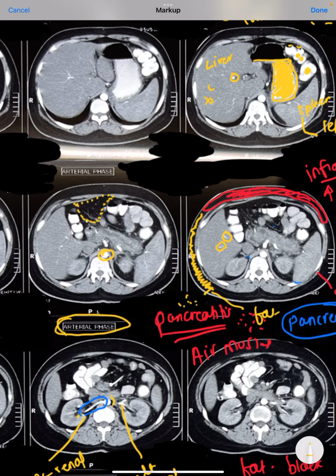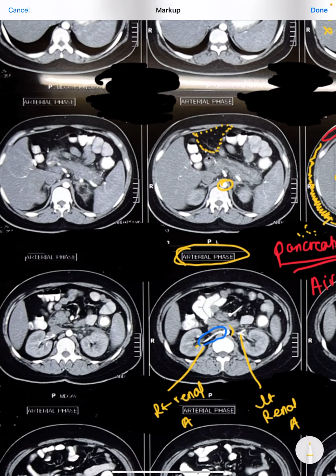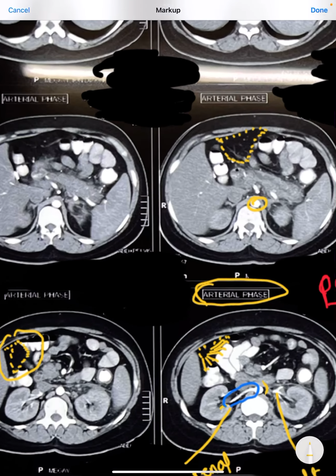So this fat is very well localized. There is no infiltration. You can simply say this is all fat, and this fat is very well localized, sharp. There is no white lining in it, because whenever there is inflammation, there will be increased blood flow, and automatically some white streaks will appear. So here also there is very well differentiated black region. There are no white linings. Now compare the same thing here.